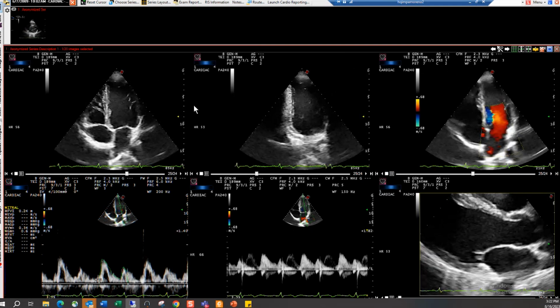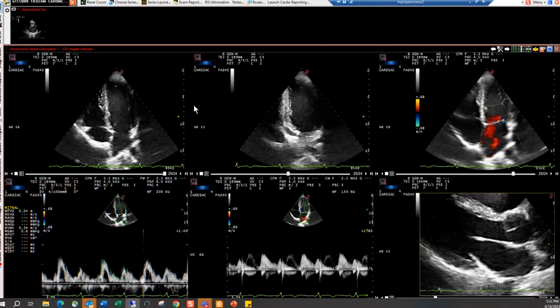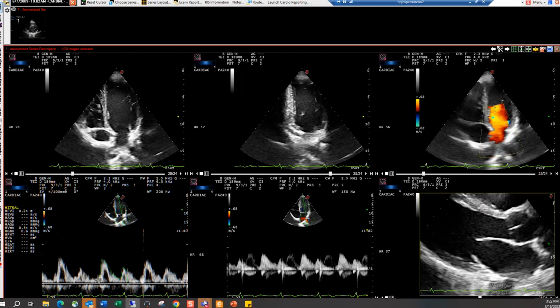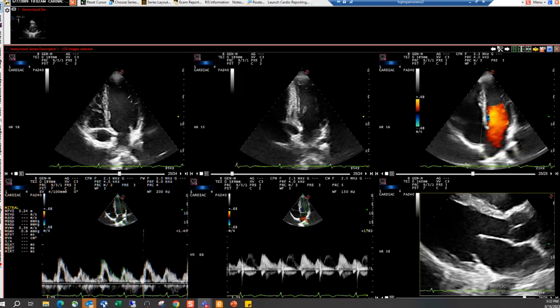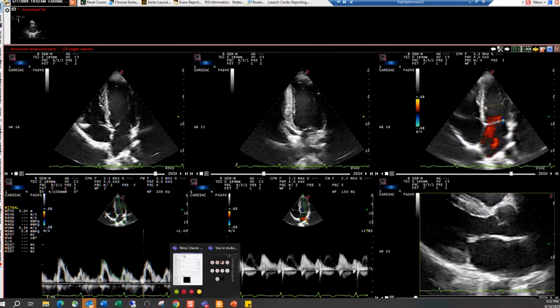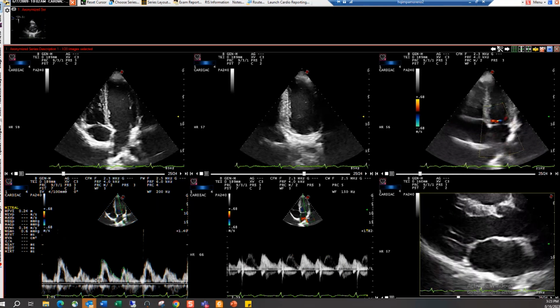So NovaCardio supports all cardiology imaging types that we saw. We saw echo, vascular, with DICOM secondary capture. We can export nuclear cardiology studies, nuclear stress tests. It's compatible with all the different types of all of the studies.